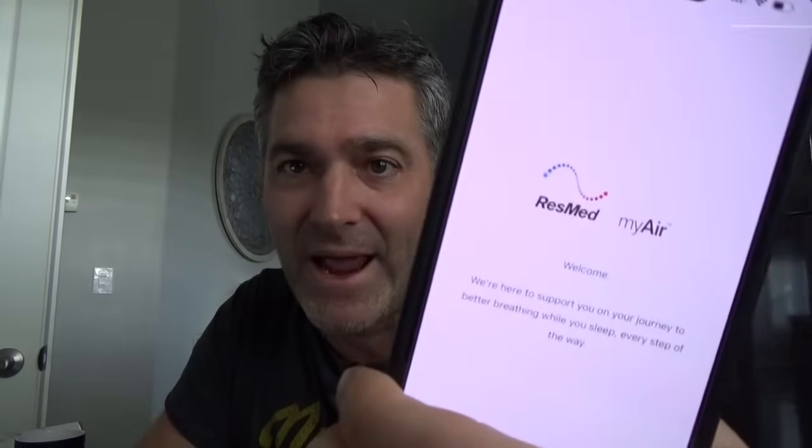The reason for this video is most of you people are busy using the MyAir app. The MyAir app is complete crap. The app is giving you a summary of your entire night of sleep data that is very granular, very detailed, with a lot of nuance. But it takes a whole night full of every breath you've taken with your PAP therapy device and your leak trend window, and then all of a sudden it just summarizes it and says, night was good, night was bad, leak was good, leak was bad. And it just spits it out at you.